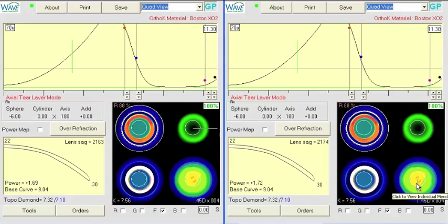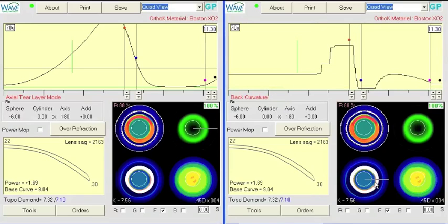So if we cut that in half and go to the back surface curve, we can see right now the base curve extends out to a radius of about 4.5, and I would set that to around 3.6. That will still give us fairly good treatment and then give us more lens to use for alignment on the cornea. So right now it's at 4.5.